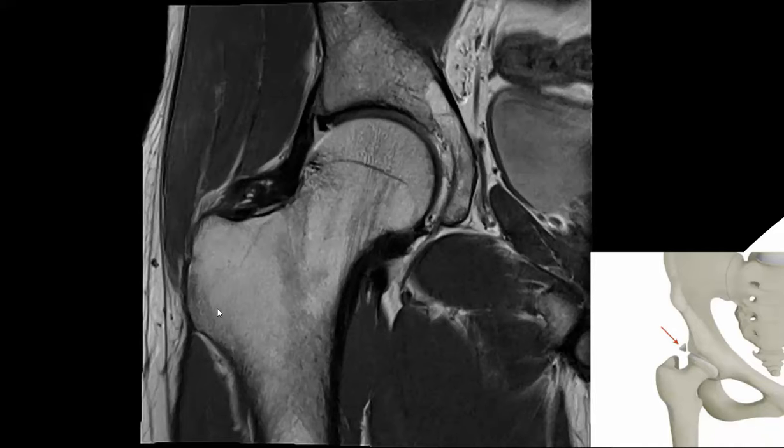The medullary spaces of the femoral neck, which is what we see here, is a bit greyer, not as bright. These regions typically contain red marrow, which on T1 weighted MR imaging, which is what we're seeing, is lower in signal intensity compared with normal fat and yellow marrow. So this isn't abnormal, this is normal. It's a sort of reservoir for red marrow.